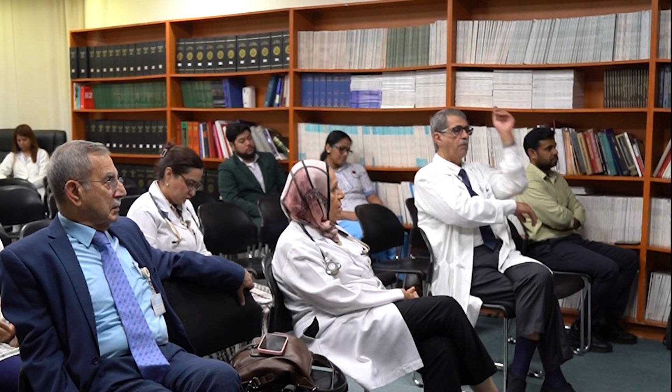These are the situations I face with patients where we cannot give a definitive diagnosis. It's more painful than a definitive diagnosis. I think in this patient we have to always err on the side of malignancy, irrespective of whatever the biopsy and the various imaging findings are. I agree. And imaging is strongly pointing towards HCC.